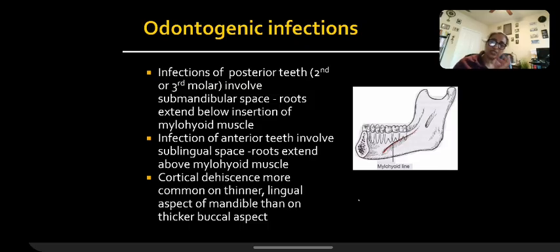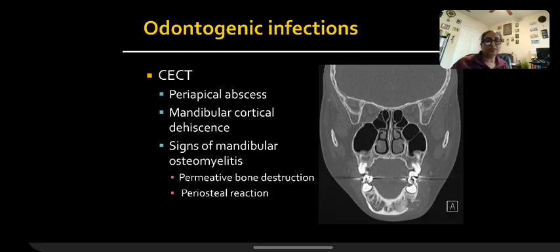But that said, I've seen it on both sides, but this is what the classic teaching is, that it's more common on the thinner lingual side. Okay, so let's look at a few examples.